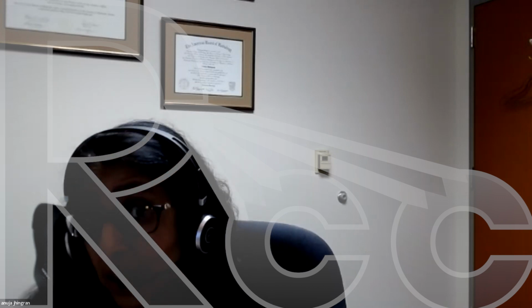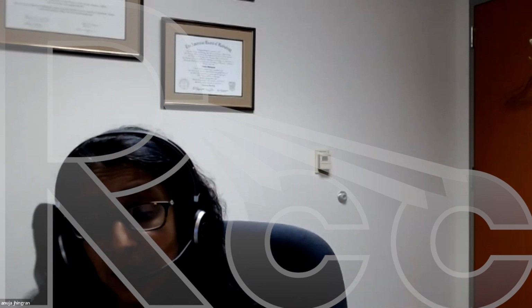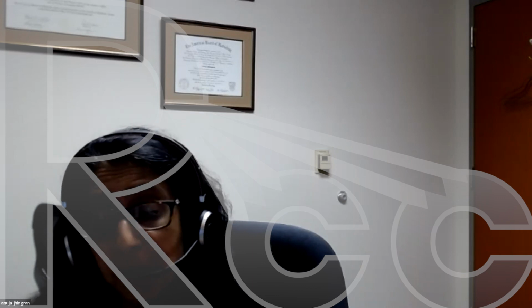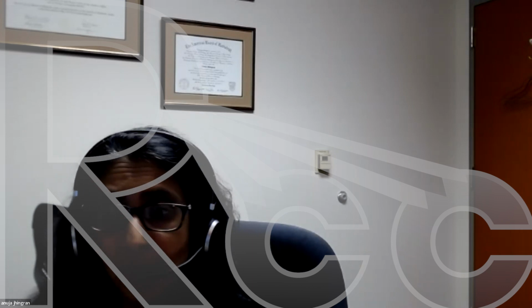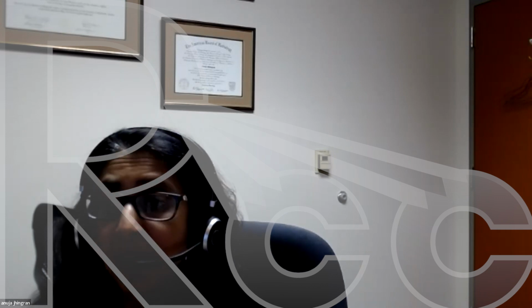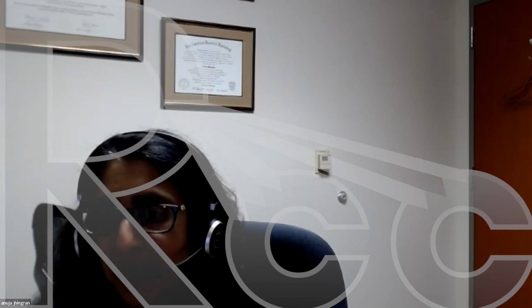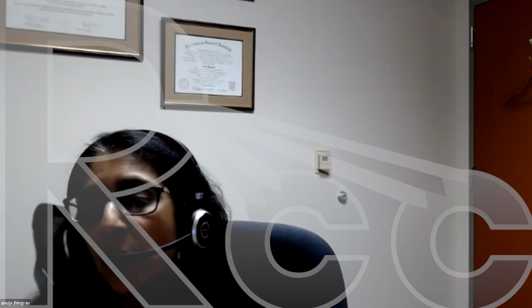For endometrial, sacral nodes are not going to be involved. Our CTV goes to mid S2, so our PTV goes to the bottom of S2. So that's the one place, even in EMBRACE, where they're actually using bony landmarks and not the piriformis. How do you determine who to treat for post-op cervix? So the question is, who do I treat for post-op endometrium? That's the question, right?